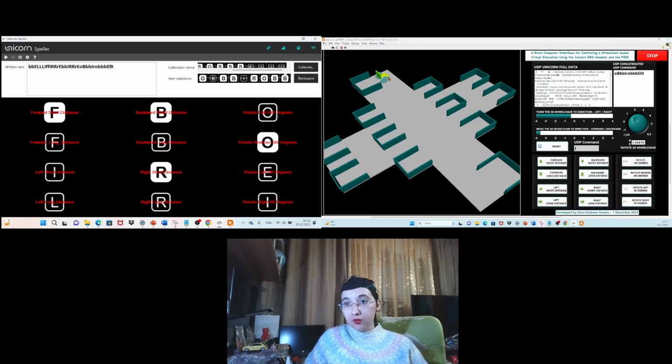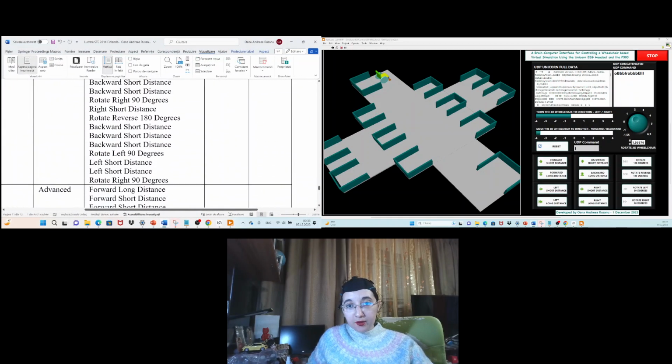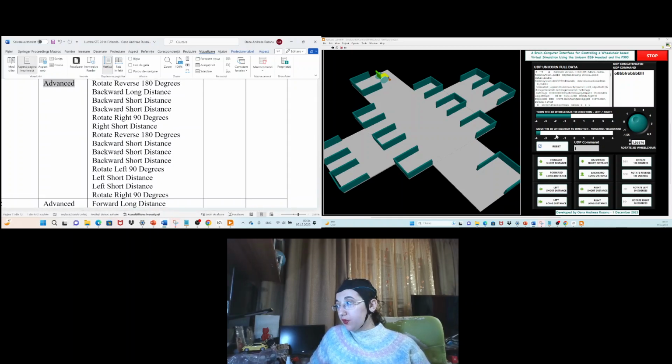Okay, so these were the commands. Here is the wheelchair. Yes, here all the commands were correctly detected. So before I add the pass results, I want to check them again by manually controlling the 3D virtual wheelchair to be sure that I set them in the correct order.